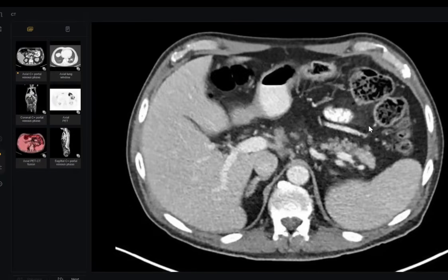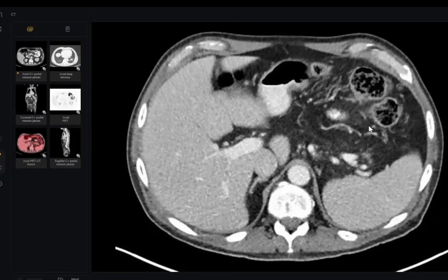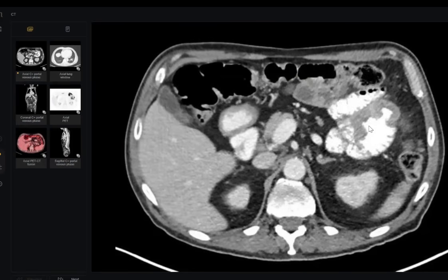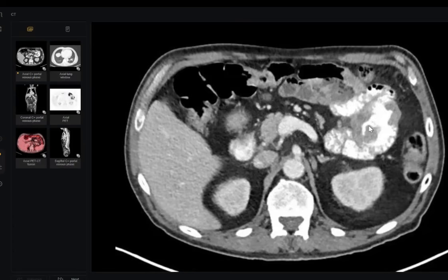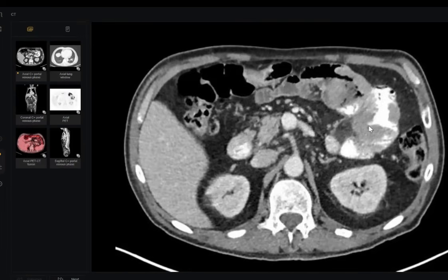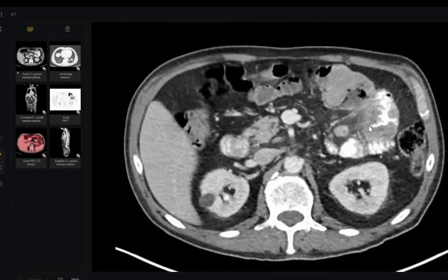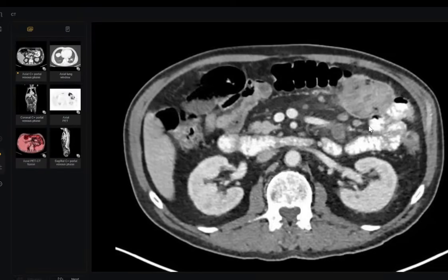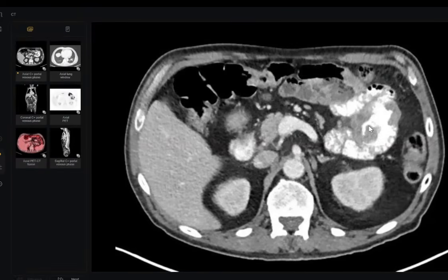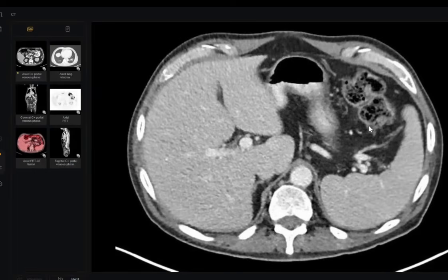But the most obvious abnormality was in the upper abdomen, where there was an aneurysmally dilated bowel loop with thickening. Likely this is proximal jejunum that is involved with circumferential mass-like involvement and aneurysmal dilatation. I could not appreciate any upstream bowel dilatation.